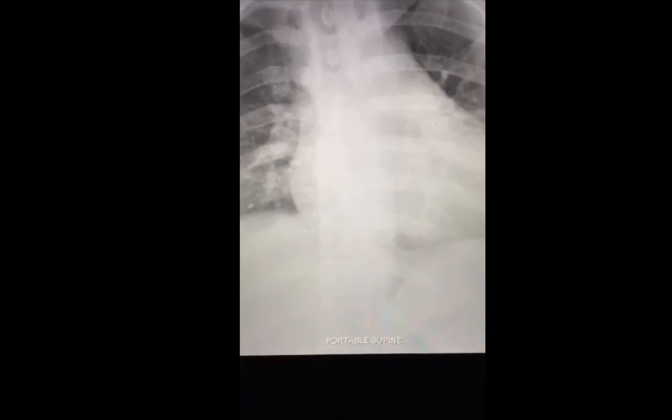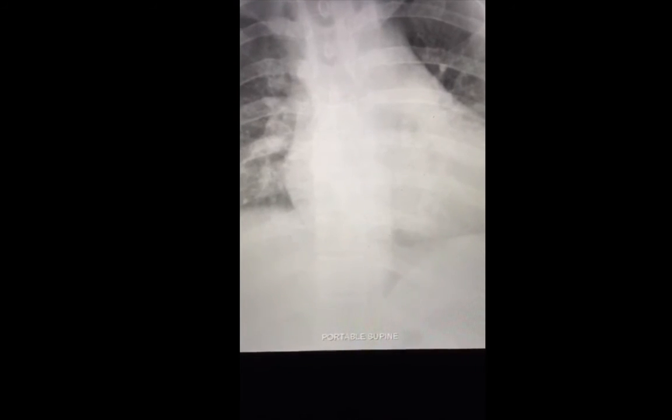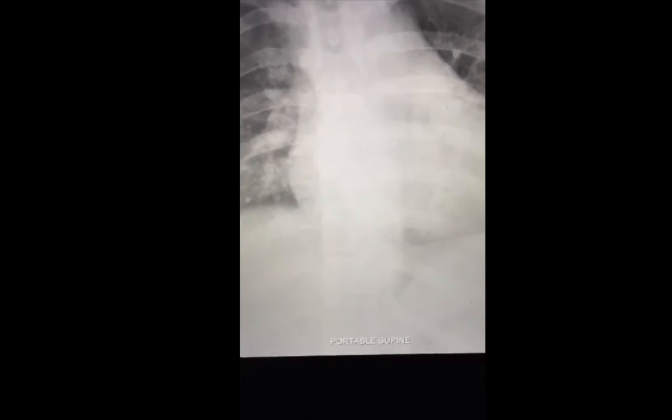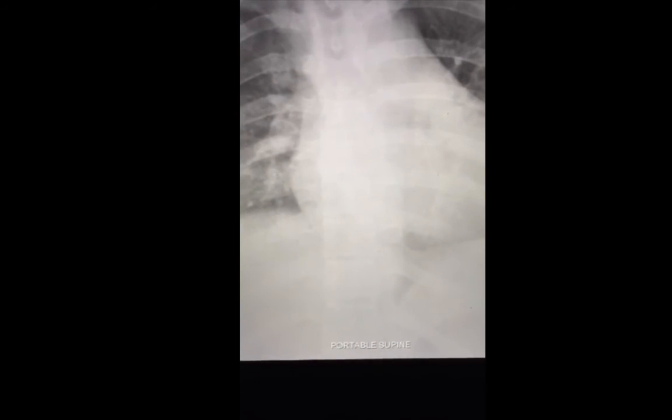We know that a cardiothoracic ratio that exceeds 50%, meaning that the heart is more than 50% of the thoracic diameter, is abnormal. But you should always remember that you can only rely on this rule if the X-ray is done in a standard way. A standard chest radiograph is performed in a patient who is standing in suspended full inspiration, well centralized, and in postero-anterior projection, meaning that the X-ray comes from the back of the patient and hits the film in front.